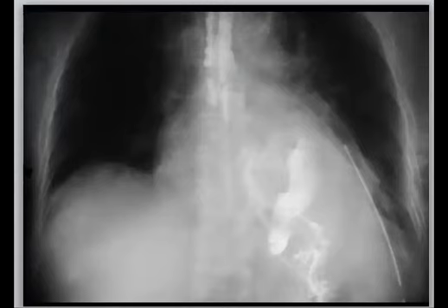So Boerhaave is coming from vomiting, chest pain, from straining, or maybe blunt trauma. So this is what is called Boerhaave syndrome. So it happens with blunt trauma, vomiting, straining, the esophagus will rupture and the contrast goes outside. And it happened in the left or right side?